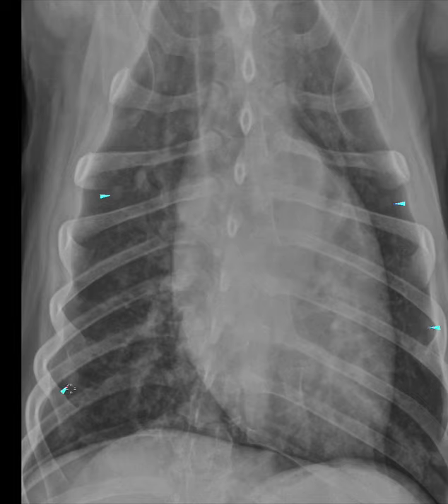They fit all the criteria that I have for soft tissue nodules. That includes that their size is 4 millimeters or greater. They're located not necessarily in line with pulmonary blood vessels, and you can see how their opacity is of a soft tissue opacity, not an increased opacity like a mineral or a summation of a blood vessel.